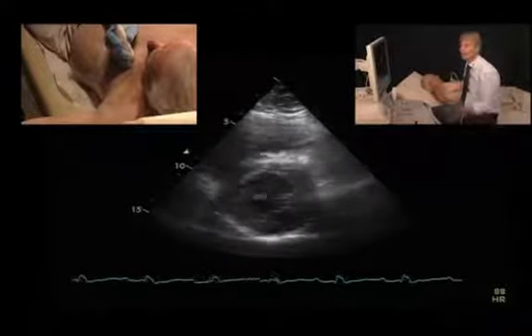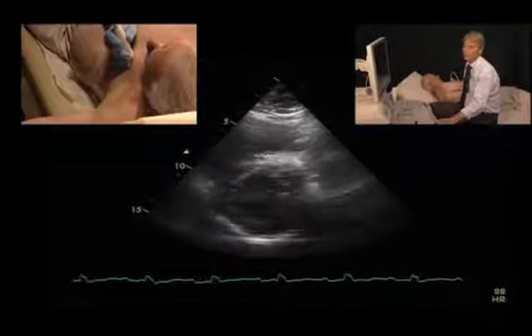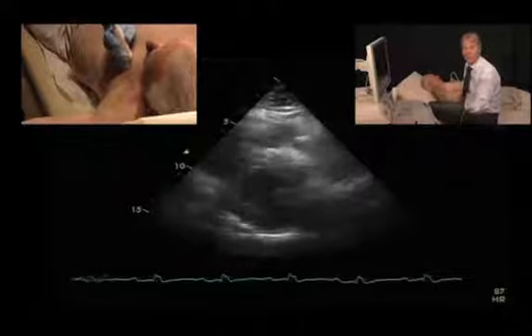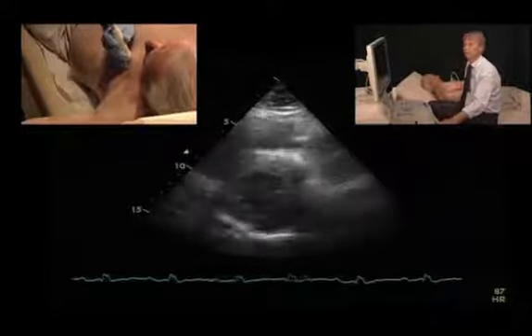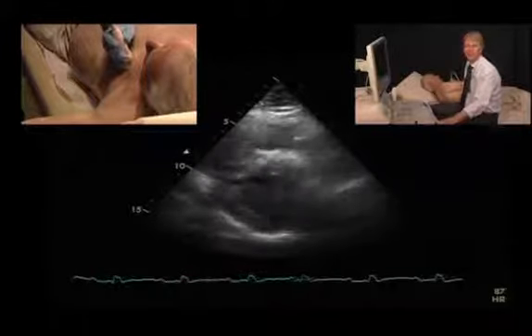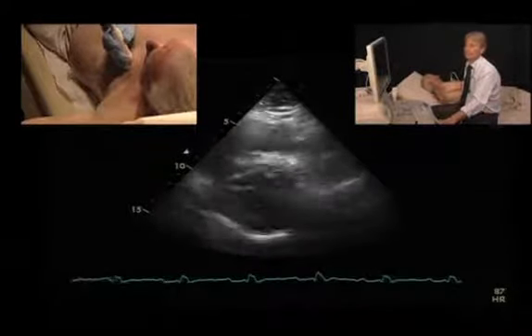Certainly hypertrophy can also be asymmetric in patients with hypertensive heart disease, but this altogether looks very much like hypertensive heart disease. If you look at the clinic of the patient as well, and you know that the patient had hypertension for many, many years, that diagnosis is quite clear. Okay, so are you ready for the next case?